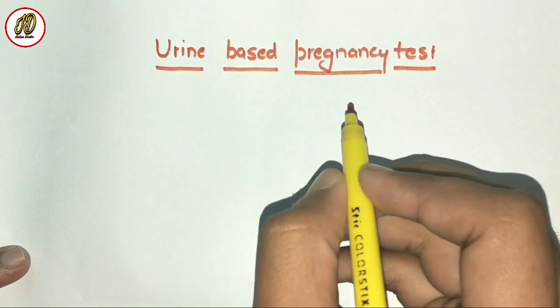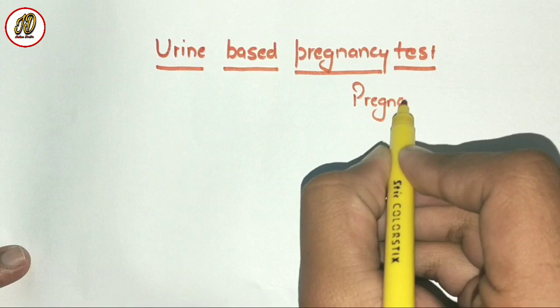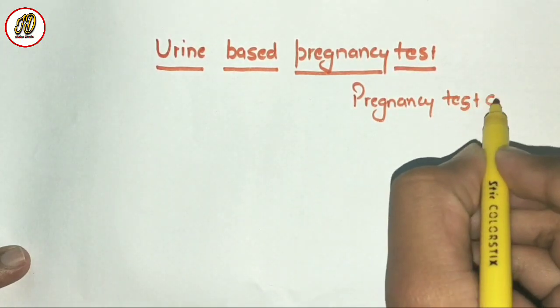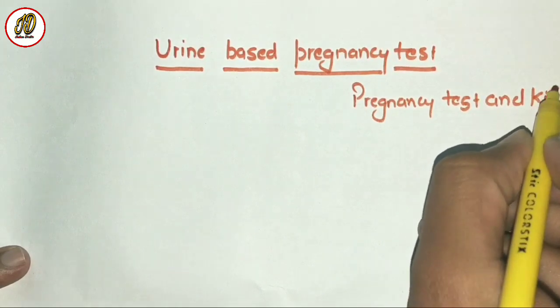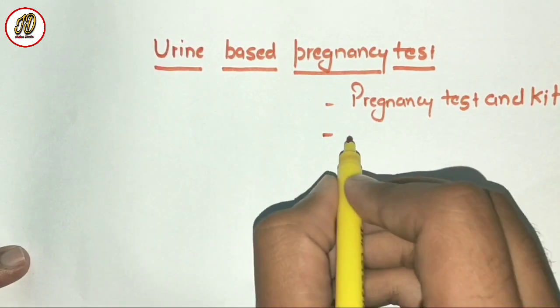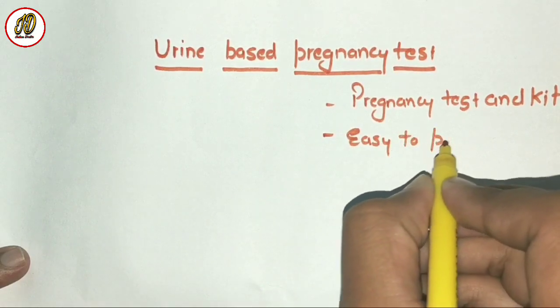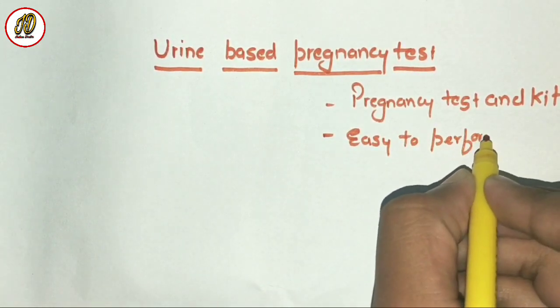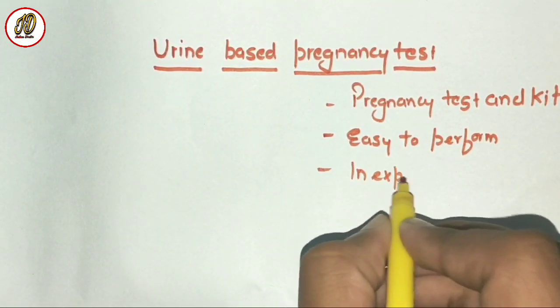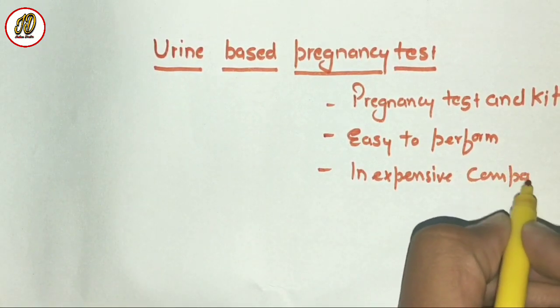First of all, we need to learn about the pregnancy test and kit. The urine-based pregnancy test is easy to perform and inexpensive compared to blood test.